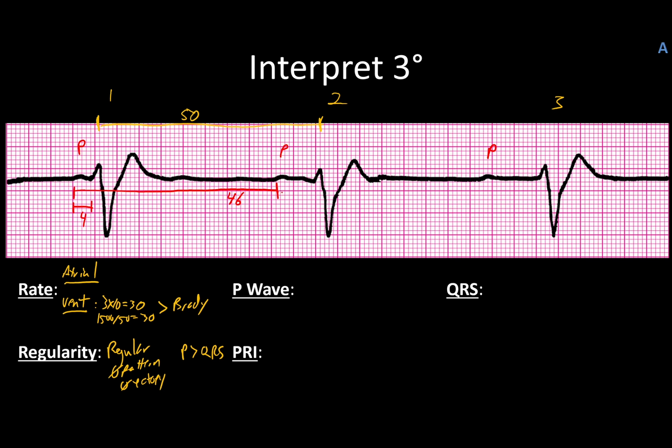Now my next one from here all the way across to the next, oops, sorry, that one's also right at 46.